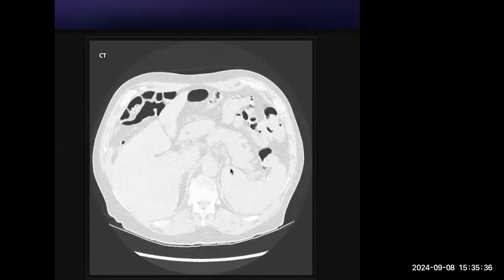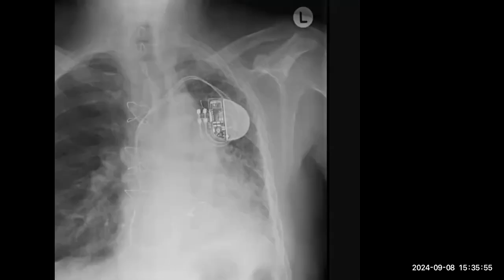Sometimes they can give you this and extrapolate it to amiodarone toxicity, which is very common. So please try to think of those connections before someone asks you. You could put that possibility forward: if this patient is on a long history of amiodarone, I would be concerned about a possible toxicity because of amiodarone. Okay, correct. So I think that's it.